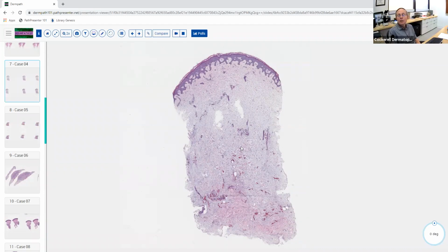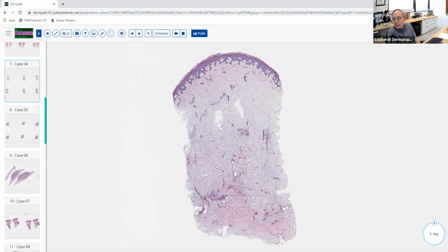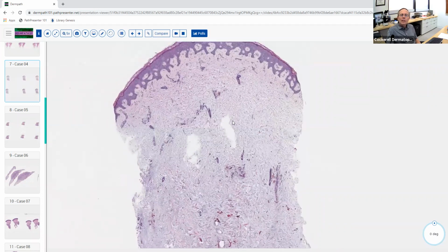Okay, good. So the general category we think of is inflammatory or neoplastic, but there's a couple of asterisk exceptions to the rule. Like deposition, maybe. Yeah, like a deposition of something. So you have to think a little bit outside the box. We say generally inflammatory or neoplastic. Well, maybe it's not either one of those. And then you start saying, well, maybe it's an abnormal deposit of something, but we'll talk about that. So what part of the body are you on, or can you really tell?